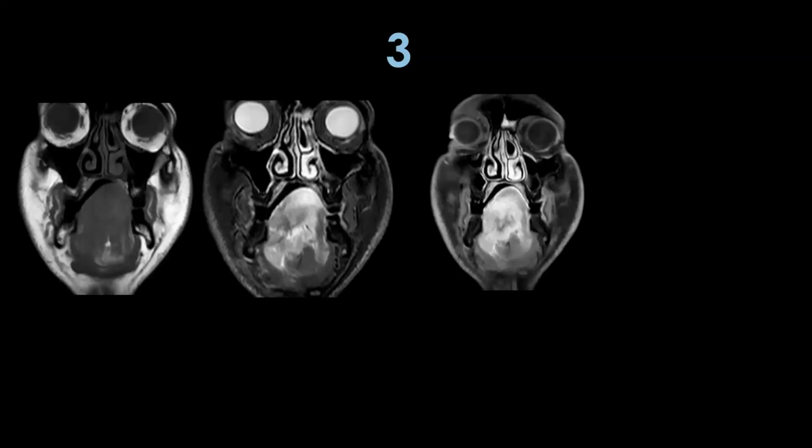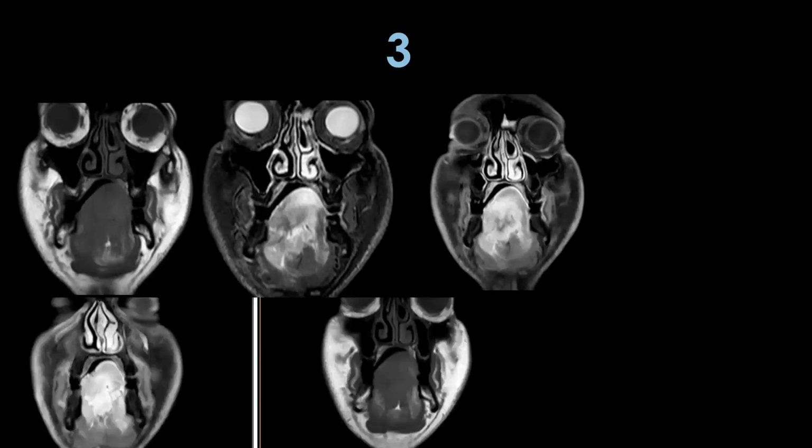Extensive tongue lesions. Yes, this is an extensive tongue lesion, sir. It is involving the floor of mouth. I think at the center is the right lateral border of the tongue, and it crosses the midline, going to the opposite side. Both sides floor of mouth is involved.